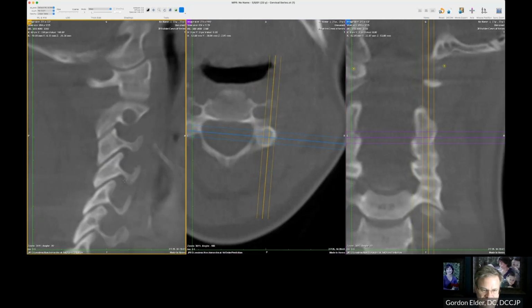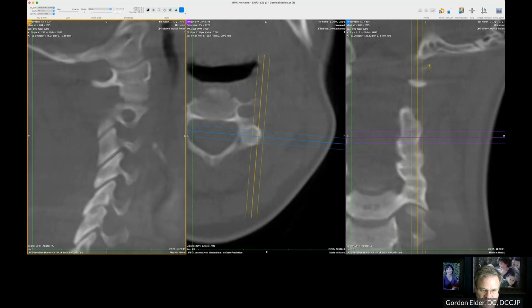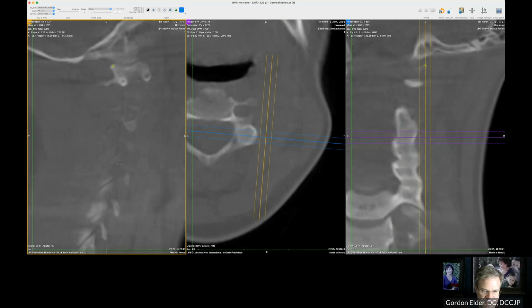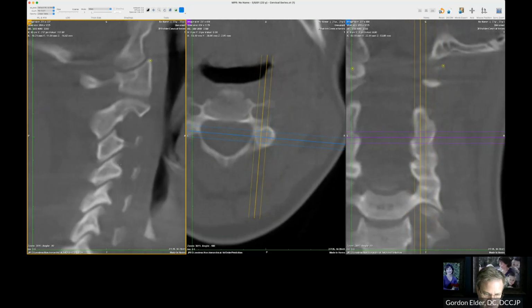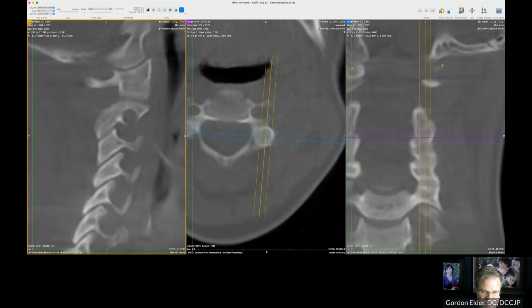Well, first off, I'm just going to see if anything is obvious and jumps out. You'll notice that these will disappear at the same time. When it's misaligned, like this one here, this might be posterior just because of how that's disappearing. That's just a clue. It's not ideal. But I'm going to run back and forth, see if anything's obvious. Nothing's super obvious there.